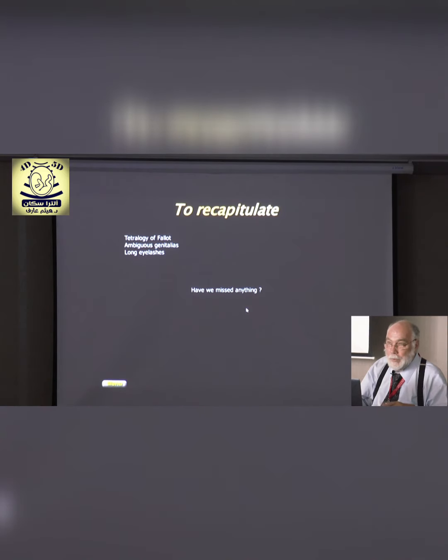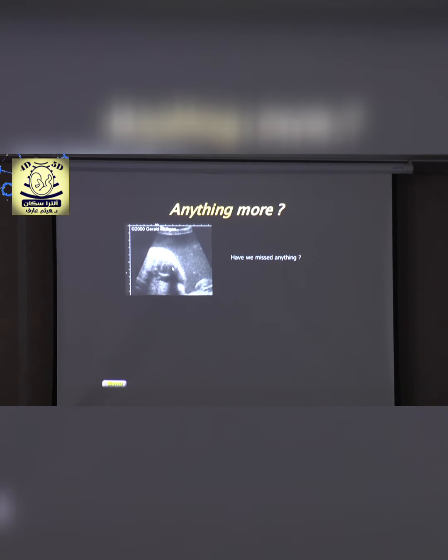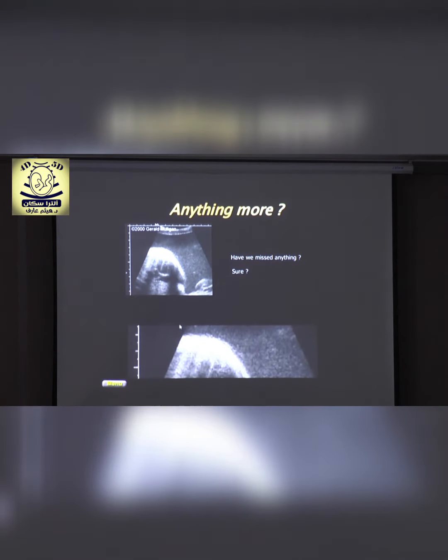Now, one more thing. What do you think about the imaging fluid here? Normal or too bright? Too bright. Too bright because there are some particles or some blood, or because the gain is too high? Yeah, the gain is too high here, and the reason for that is he wanted to show this thing here. What is that?